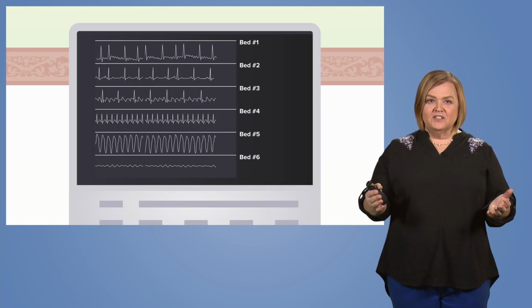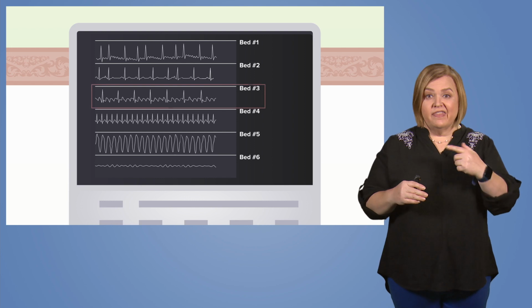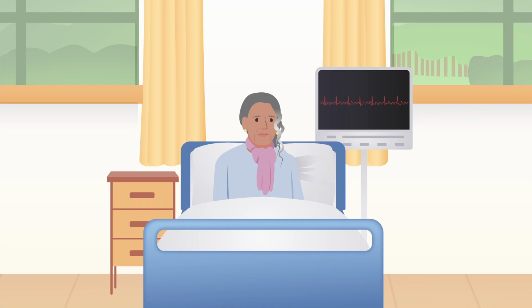Now we're back with our patients. This time we need to check on this woman. After our previous discussions, at first glance, we definitely know something is wrong with this ECG. But what exactly is it? Let's take a closer look. This ECG is atrial flutter.